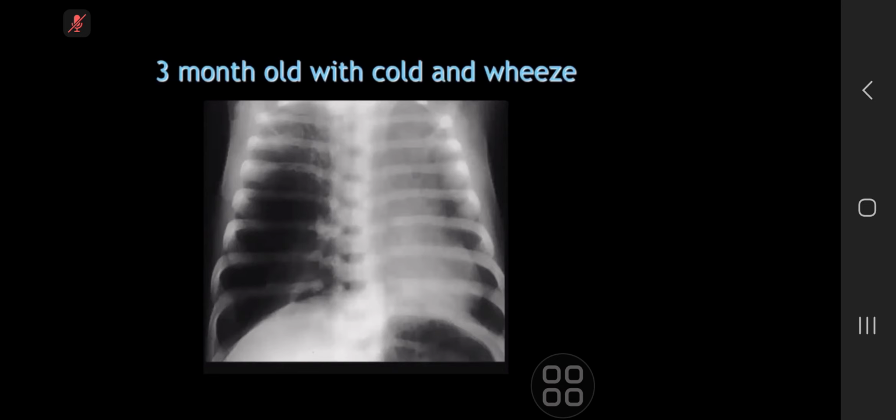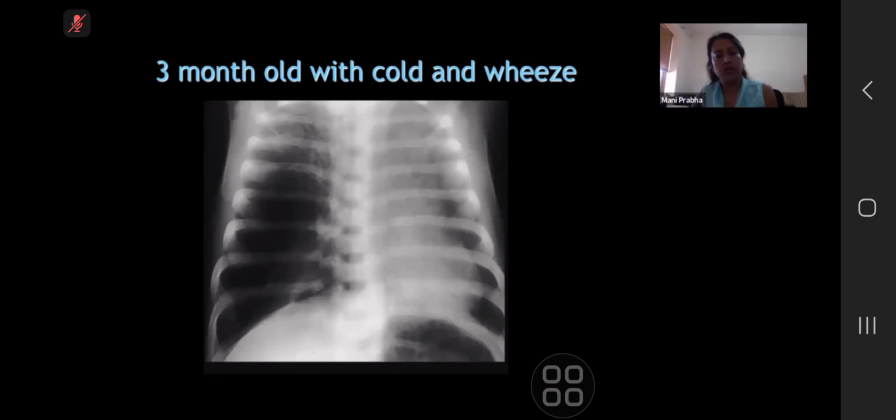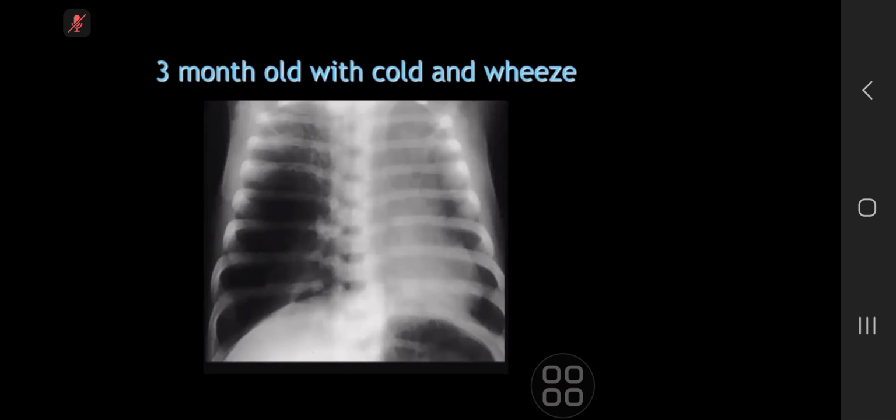Yeah. So would you proceed for cross-sectional imaging, or what would you do next? Because we've got a mediastinal shift, in my day-to-day practice I'd want to inform the pediatric team, because that needs to be addressed first before we move on to further imaging. With lobar emphysema, we could do a CT as well to better delineate.